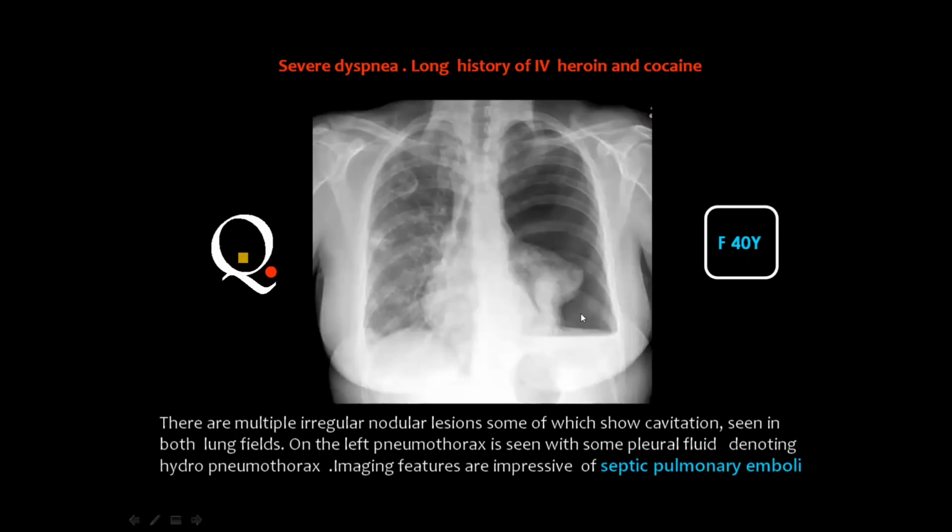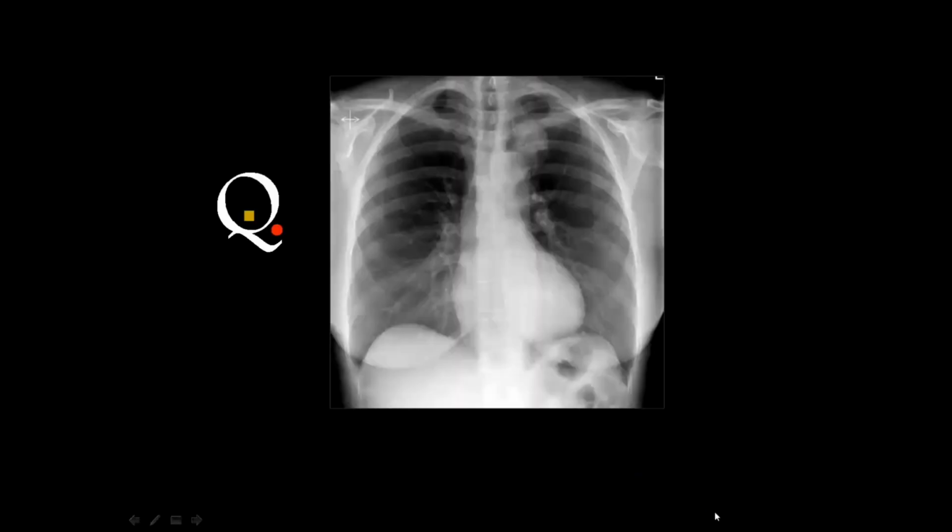This is not tension because the heart is almost at its side, and the diaphragm is not depressed, but there is fluid, and you should notice this, and this is hydropneumothorax. Next case is a chest X-ray, and you may easily appreciate the opacity present in this X-ray.